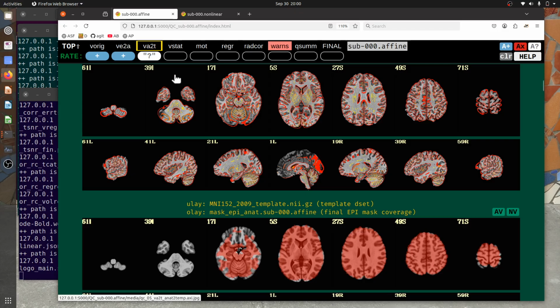All right, I'm going to pause here for these first few sections, and then we'll continue looking at more of the HTML in a different video.